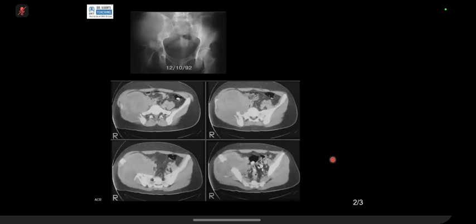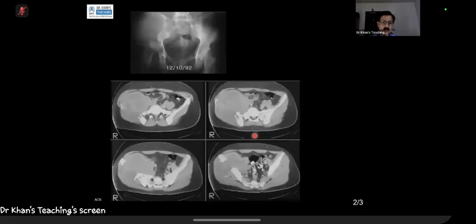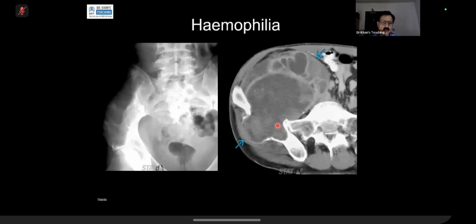Yeah. So these pseudotumors, particularly when they bleed into the periosteum or adjacent soft tissue, can cause a lot of destruction. And they will give you a bizarre appearance, that is the word, and it was given in that StatDx slide which I was showing you. Bizarre. It will be absolute destruction. It has completely destroyed it. It has caused dislocation of the hip joint. And there is a hematoma here. So this was the pseudotumor part of it.